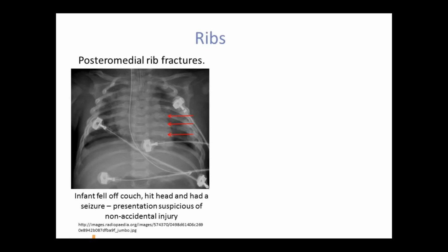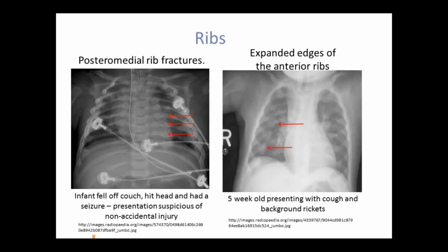Other rib abnormalities include bifid ribs that are often picked up in the pediatric population and present as an asymptomatic hard mass. Additionally, look for expanded anterior edges in the ribs, a marker of rickets. Destructive bone lesions may point to the presence of infections or malignancies.